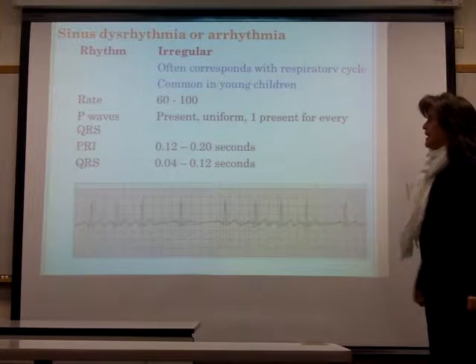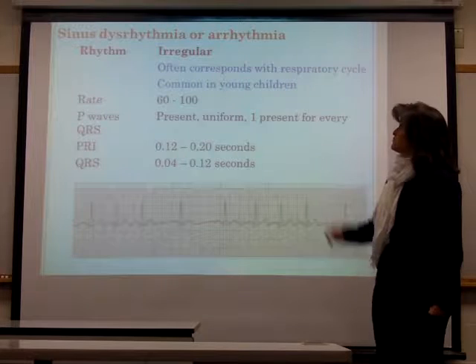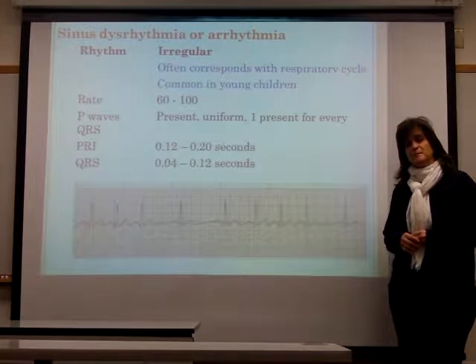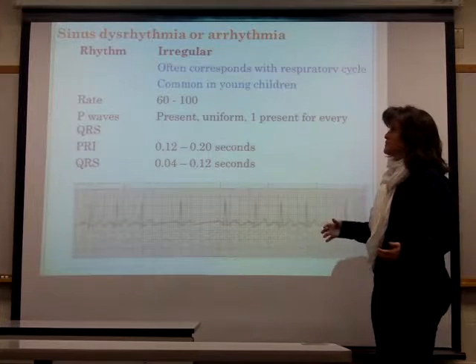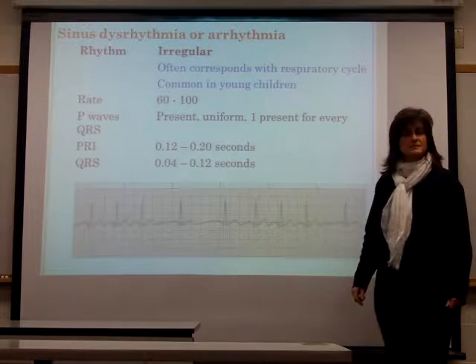So now we're going to look at some more sinus dysrhythmias or irregularities. Sinus dysrhythmia or sinus arrhythmia, you'll probably hear it called sinus arrhythmia more often because it's just easier to say. When you compare it, like so many other rhythms, to normal sinus rhythm, the only difference generally is the fact that the rhythm is irregular.